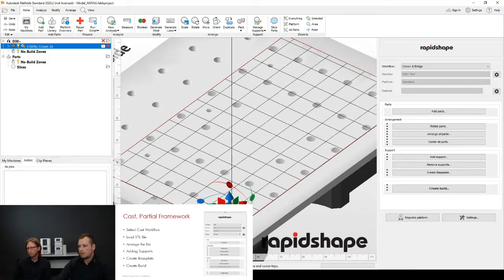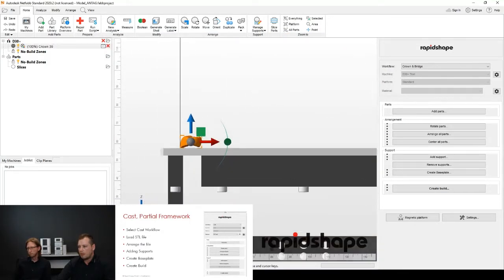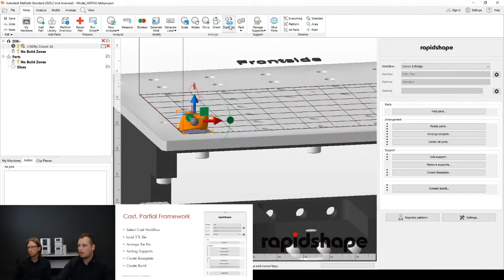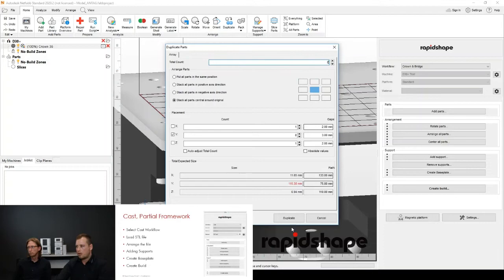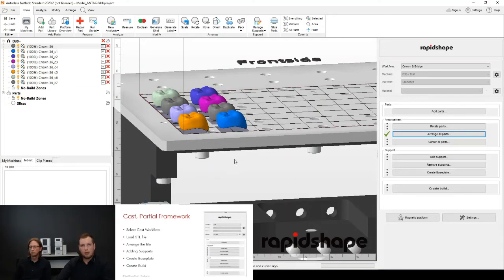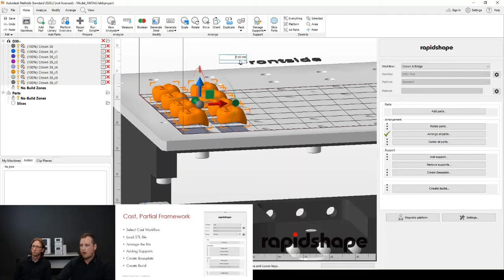For this instance, this is not applicable, but this will allow you to manipulate it either manually like this, or if you have multiple parts, for instance 8, we can position them. So if you have 8 parts and you want to move all of them up with the same amount, you can manually do that here and then select how high you want to move that.